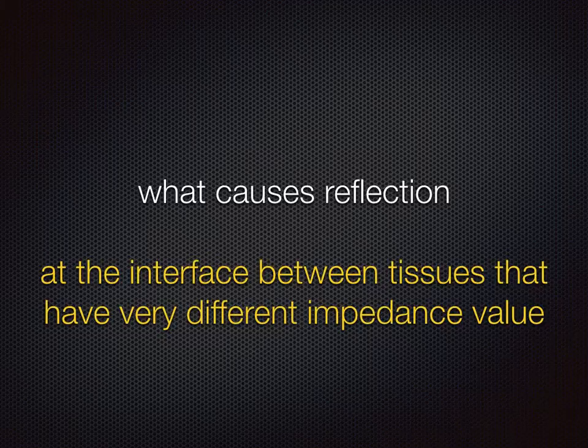And that's shown as a very white area on the ultrasound screen. So, if it's white, it's a big reflecting area. If it's black, it's not a reflecting area. And then there's obviously shades of grey in between. And remember, the ultrasound picture is being refreshed many thousands of times a second in order for you to see things in real time.